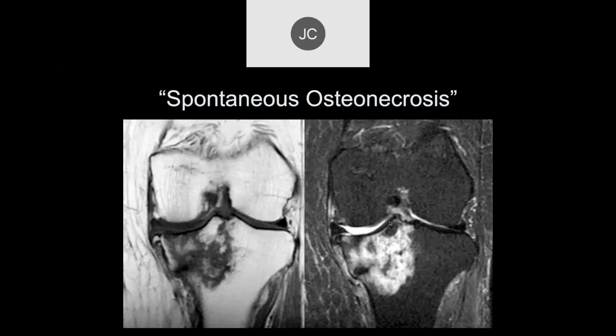Okay, so in the medial tibial plateau, there's irregular signal. The subchondral bone looks intact, probably a little depressed. There seems to be some depression.